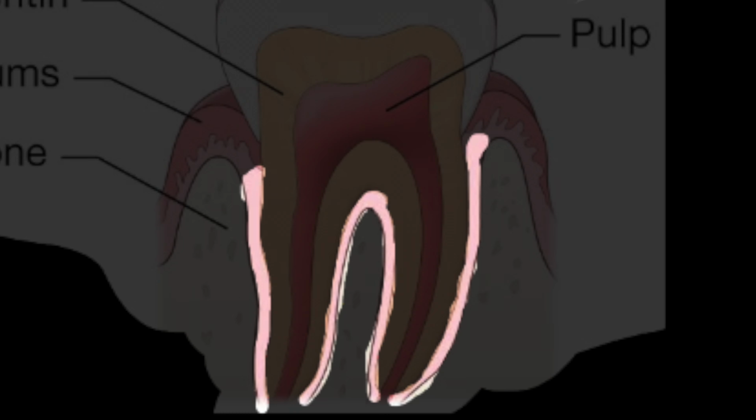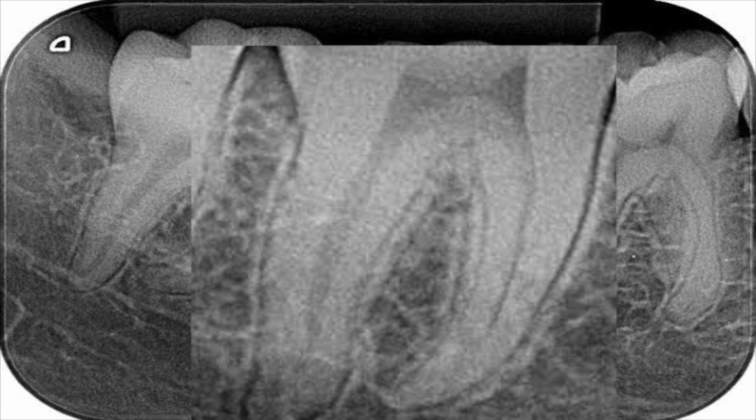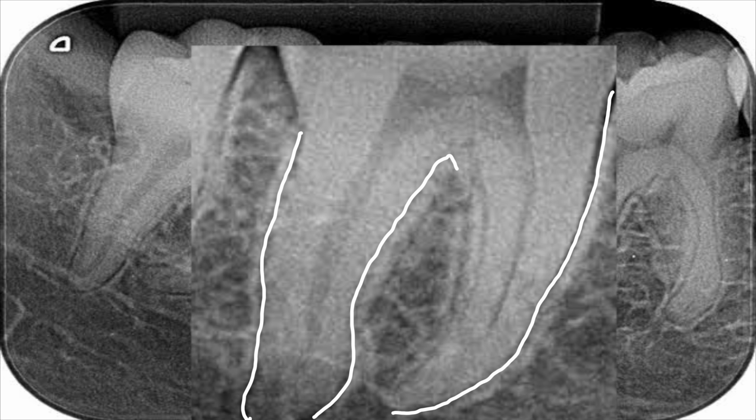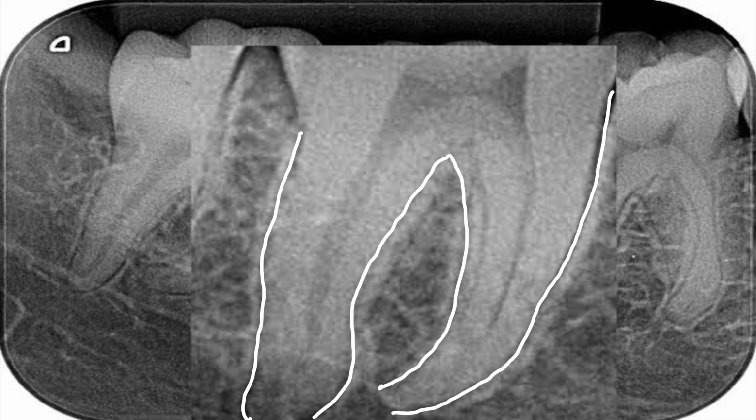It's like the quiet team member who gets the job done but doesn't need the recognition. Lastly, we have the periodontal ligament. It's the Houdini of dental tissues, radiolucent, meaning it practically disappears on X-rays. This collagen-rich structure is hard to spot, but it's there, doing its important job of keeping your teeth in place.